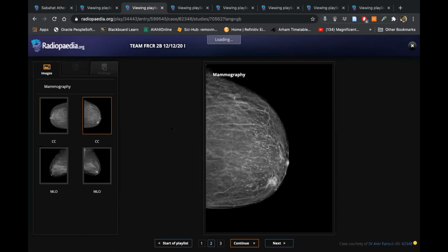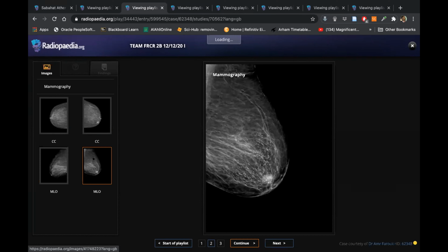The case which I got, which I incorrectly said is benign calcification, actually had haphazard calcification. It had pleomorphic and it was scattered. So that is why it was DCIS. But this one is very symmetrical, very thick, linear, rod-like. So this is plasma cell mastitis.